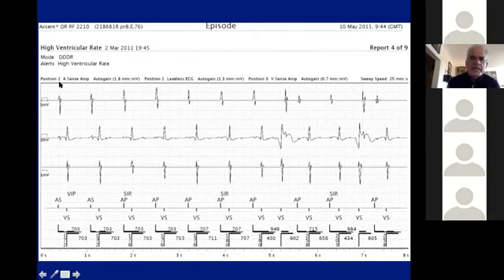This is position 1 atrial sense signal. Second is leadless ECG. So this is the far field signal that you would like to see. It helps you to differentiate better between VT and SVT. It gives you some semblance to one of the surface leads. And there is the local bipolar signal, and then the markers.